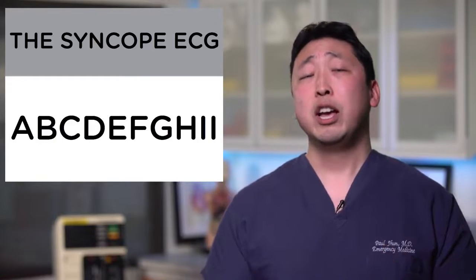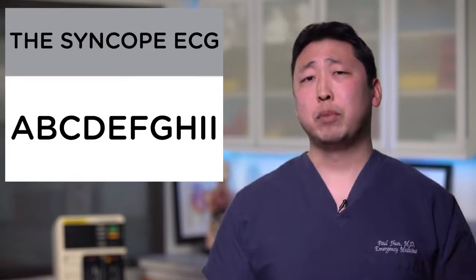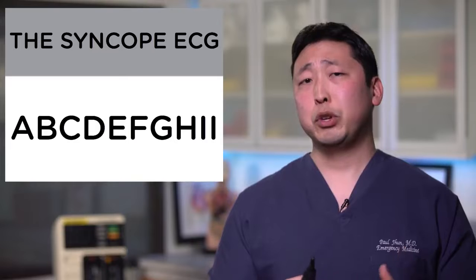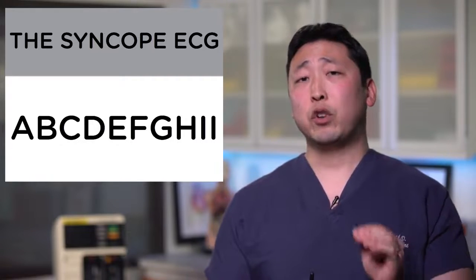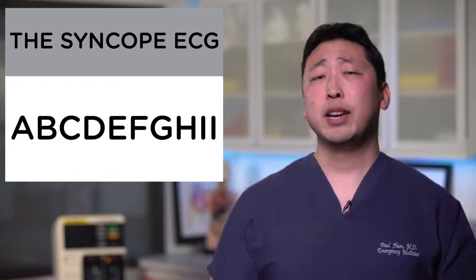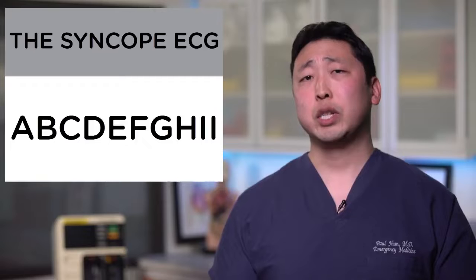D is for delta wave. As we saw earlier, you're looking for the shortened PR interval and the slurred upstroke into the QRS complex that's suggestive of WPW, or Wolff-Parkinson-White syndrome. E is for epsilon wave. You're looking for notching of the terminal portion of the QRS that suggests ARVD, or arrhythmogenic right ventricular dysplasia.